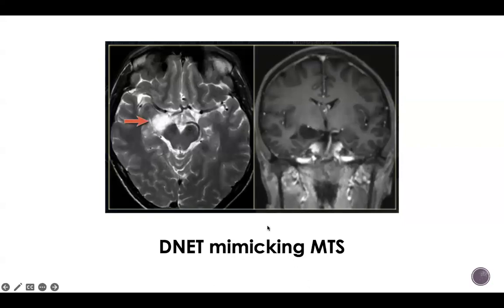This is a tumor that is mimicking hyperintensity in the right hippocampal area. And of course, here we see that there's a bubbly appearance, and it is not very similar to what we usually see in MTS.